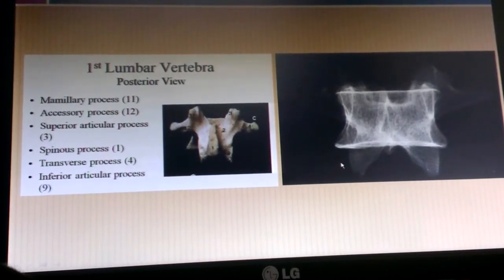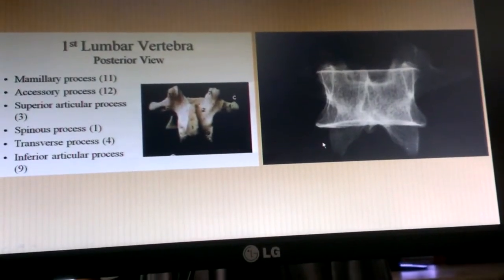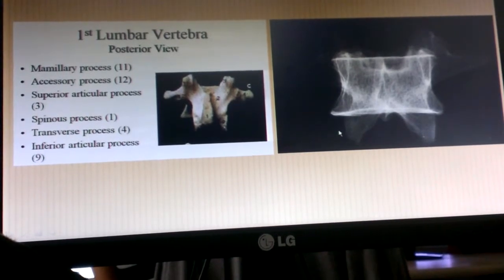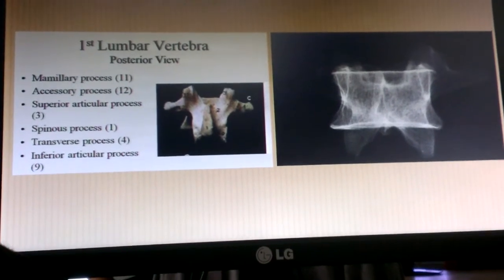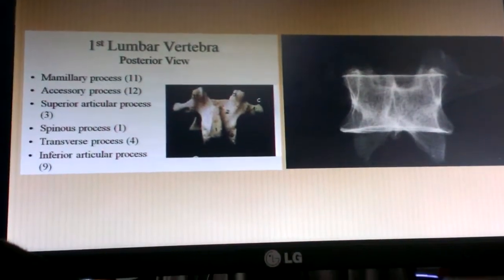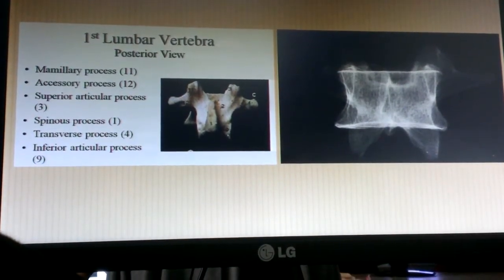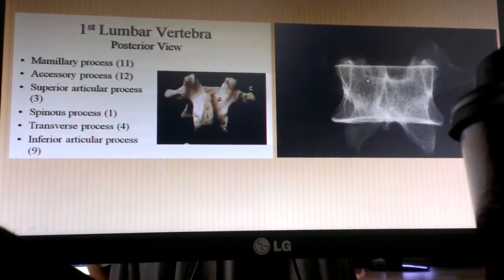Now remember that we're going to call it spondylolysis if it's in a part of the lamina, or even the pedicle for that matter, right? It's still spondylolysis. All that means is that there's a cleft. Lysis doesn't necessarily mean fracture. Lysis means dissolution, kind of. So it can be anywhere in the posterior elements, exception being the spinous process. Nothing's going to happen there. Okay, so very good.